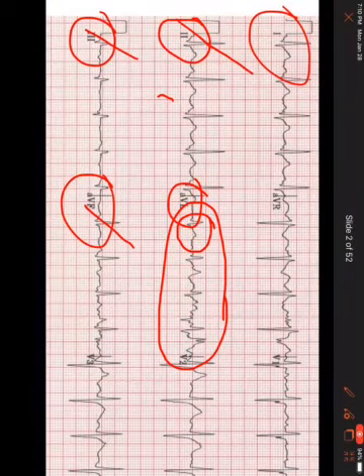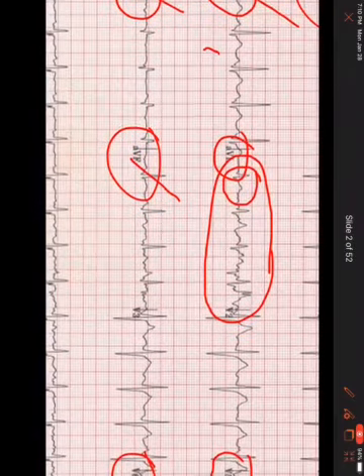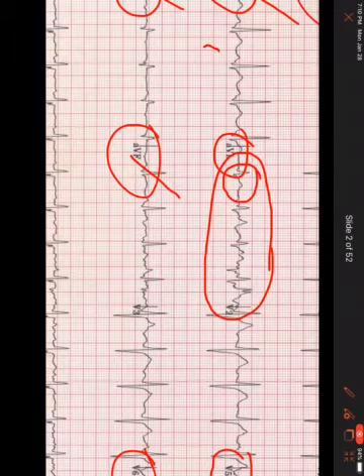So as I go to lead 1, again, all of these beats look fine to try to interpret, but I'll go to the second one, identify my J point, okay, being about right there, and if I bring my laser over, it is isoelectric, maybe a little under isoelectric, but definitely not elevated. Then I'll go to AVL. And remember, this is when I said that there's really no good beats in AVL to look at. This is a halfway decent one. These beats I would totally disregard. But we may have to go to this first beat to get the best reading.